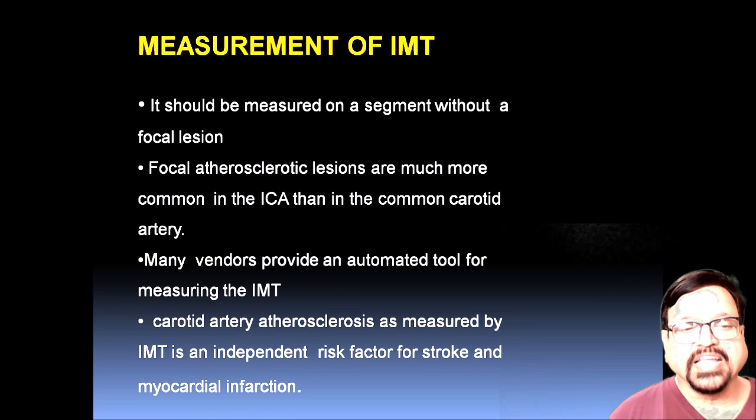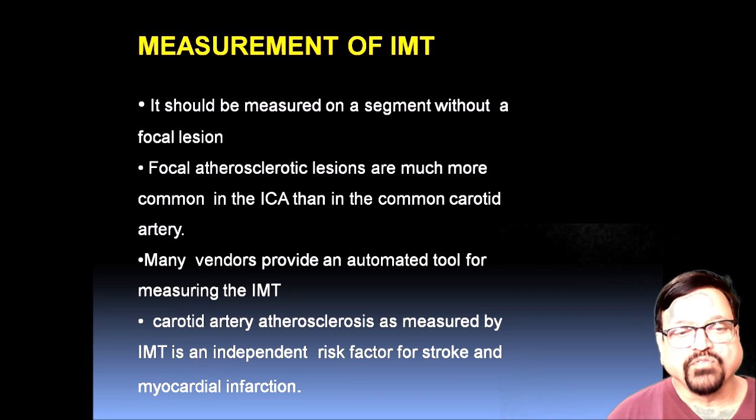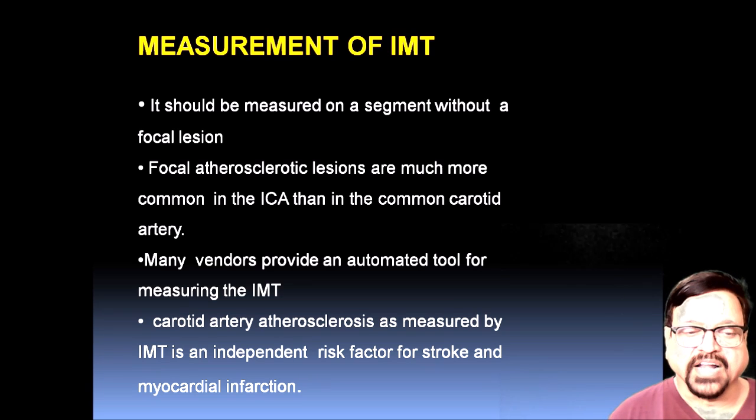Now, measurement of the intima media thickness. It should be measured on a segment without a focal lesion. Focal atherosclerotic lesions are much more common in internal carotid arteries than in the common carotid artery.